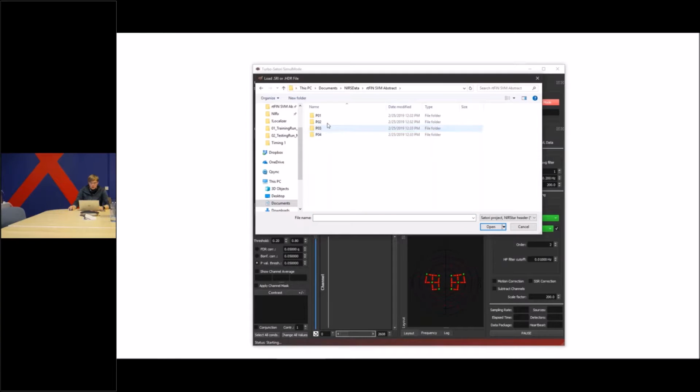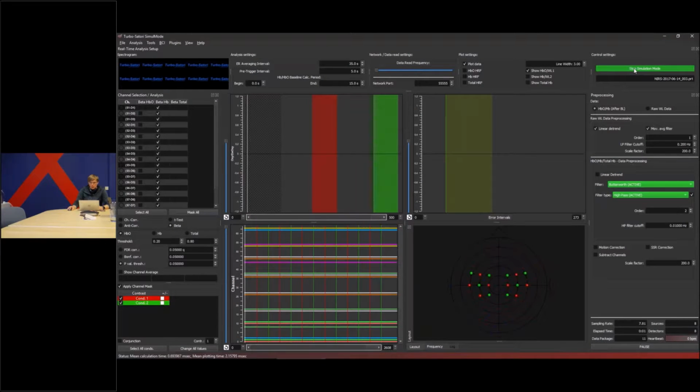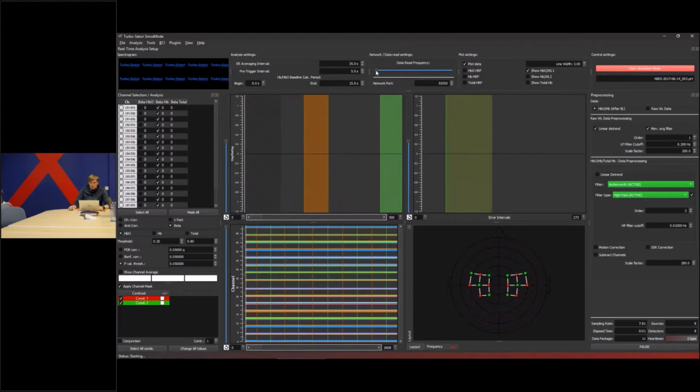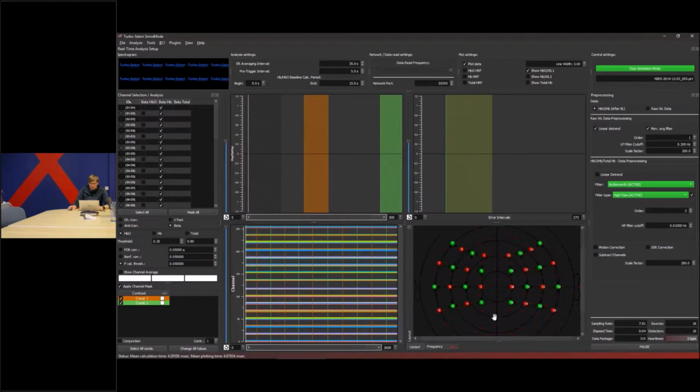So we can just rerun the same run. I think this was the small one, so we go again to the big data set. Yes, so this is the big one. So I let it run through the end of the trial.